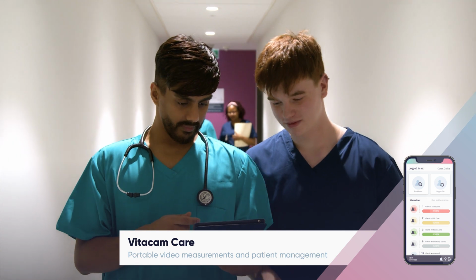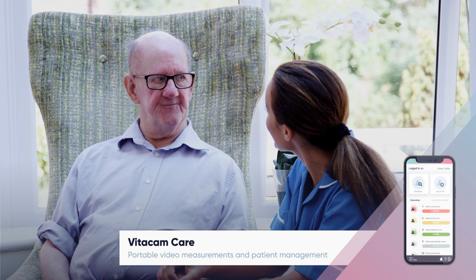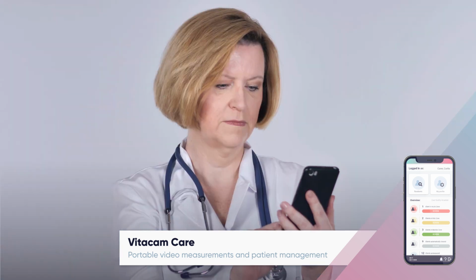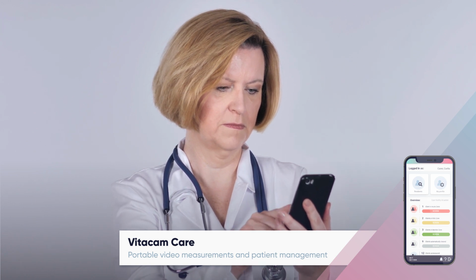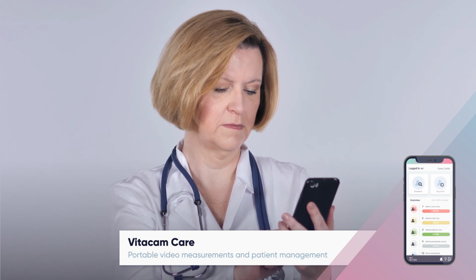Developed for vital signs measurements on the go, the application is designed for professional nurses and carers caring for a group of patients. In addition to video measurements, other vital signs values can also be manually recorded and subsequently viewed for any patient saved in the system.